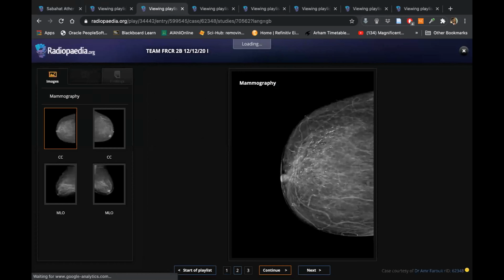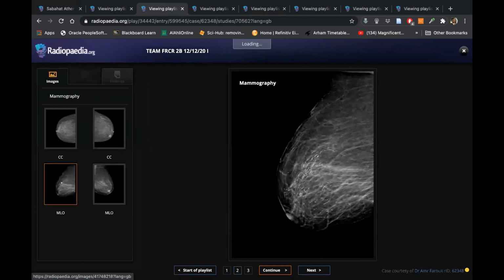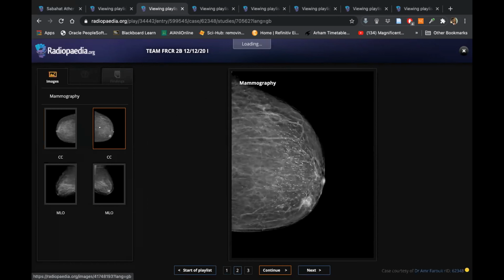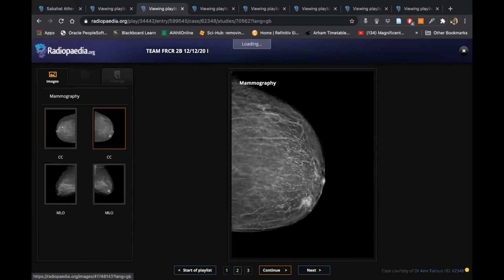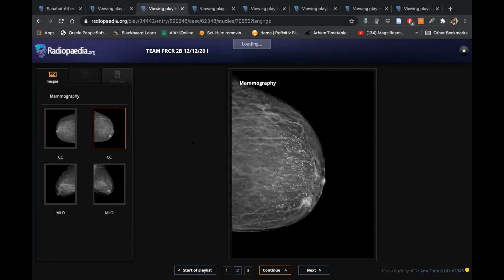There is nothing of that sort. So your first case, I know it was a bit unnerving because it seemed like it's some sort of case of Dr. Maheen when she showed us the DCIS, right? Yes. This is exactly what I thought when I saw this. But if I can convince you, you see all these calcifications are thick. They are linear, they are rod-like. Or you can use the word plasma cell mastitis. This is plasma cell mastitis.